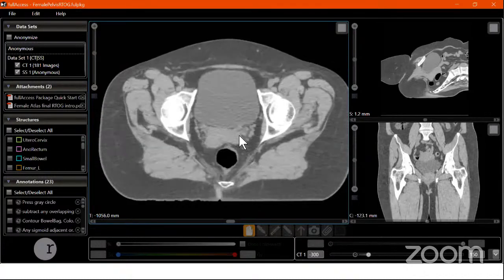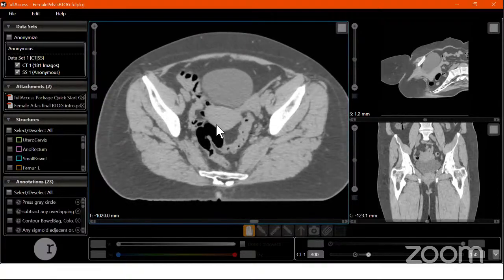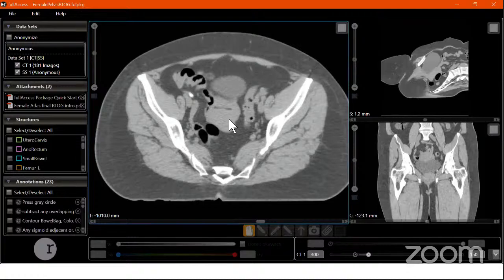Contouring the primary tumor involves all visible tumor, taken from the GTV, which we described before. In addition, we would have to include the remaining part of the normal cervix. In case there is some part of the cervix which is uninvolved, that has to be included in the CTV. And we would also include the entire uterus right up to the fundus.